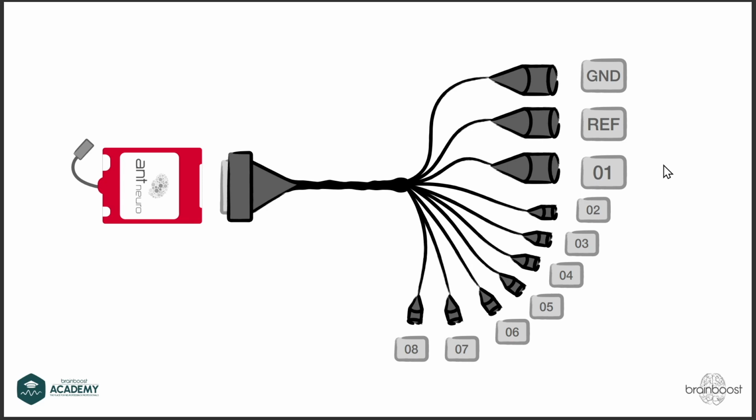What does that mean? Maybe you want to put 1 electrode on the right frontal part, and then it should be in reference to the parietal right side. And then the same for the left side. So you need more than 1 reference. So you need to tell the software, hey, channel 1 refers to a certain reference, but channel 2 or 3 or 4 refers to a different reference. So we kind of need to trick that one now.